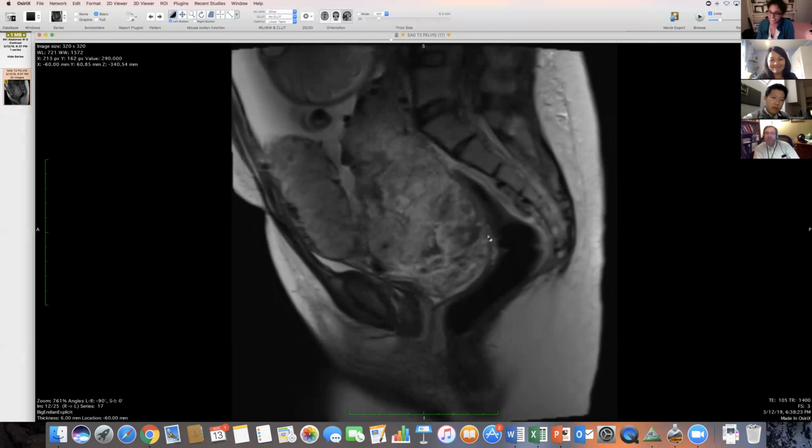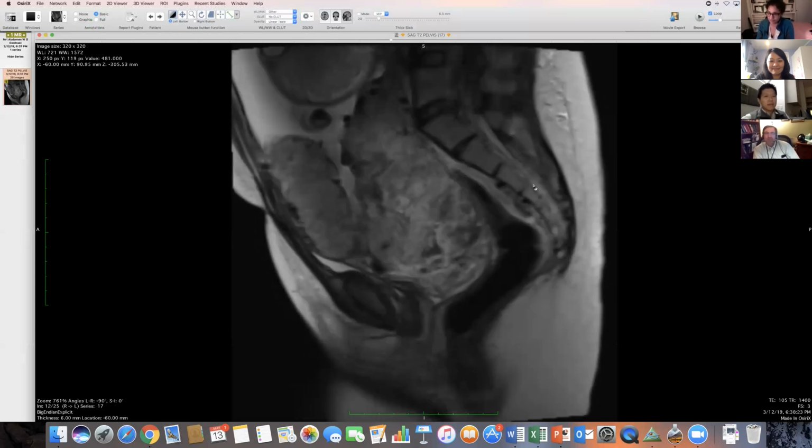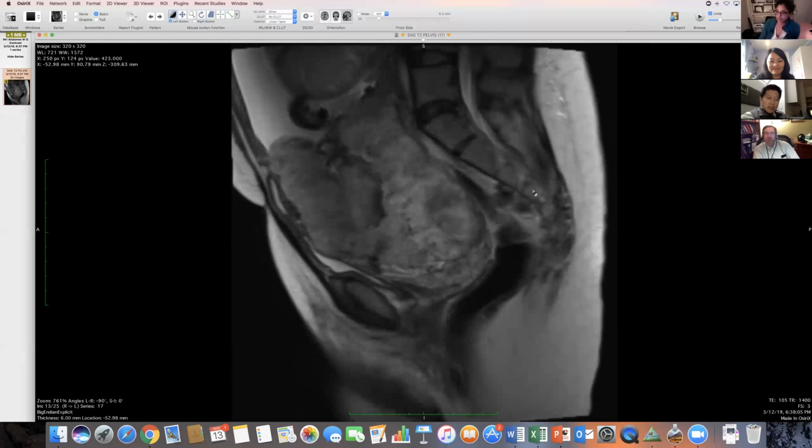I also find these accreta percreta cases quite challenging. We get about, I would say, on average, one a month, maybe two a month, and it's never any fun interpreting them. I kind of put them in three boxes. No, I really don't see much, it's pretty close to normal. Then a middle box where I think that there's abnormal placentation, but I don't see anything that I would want to call percreta. And then those third cases where you start seeing changes that are convincing for percreta, like involvement of a bladder wall or clear invasion into fat or something like that.